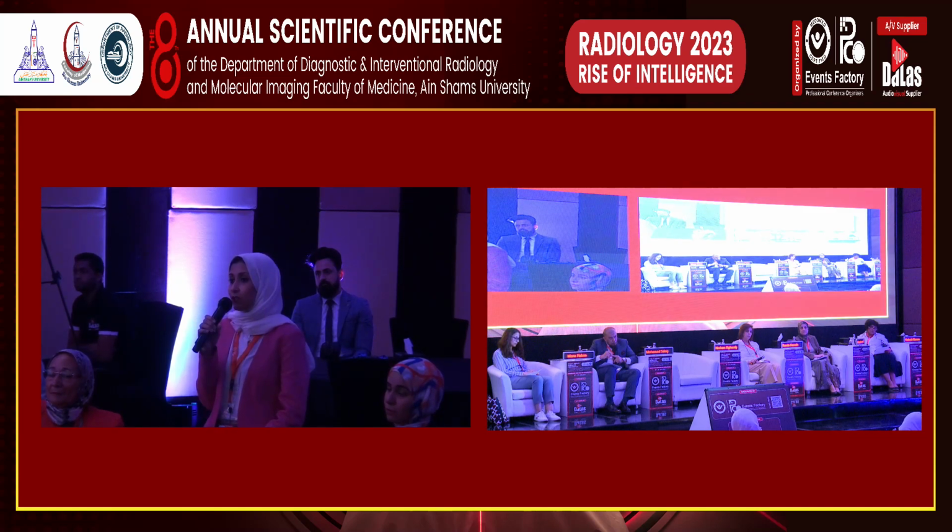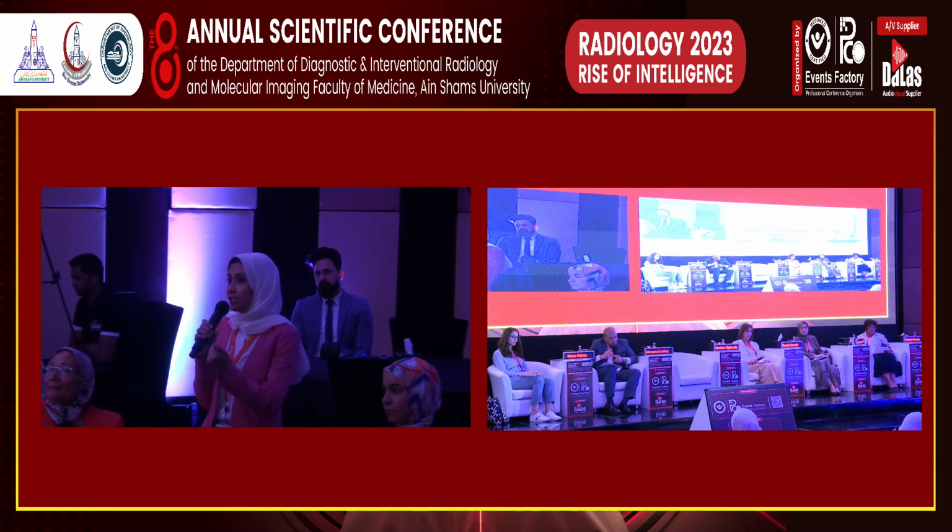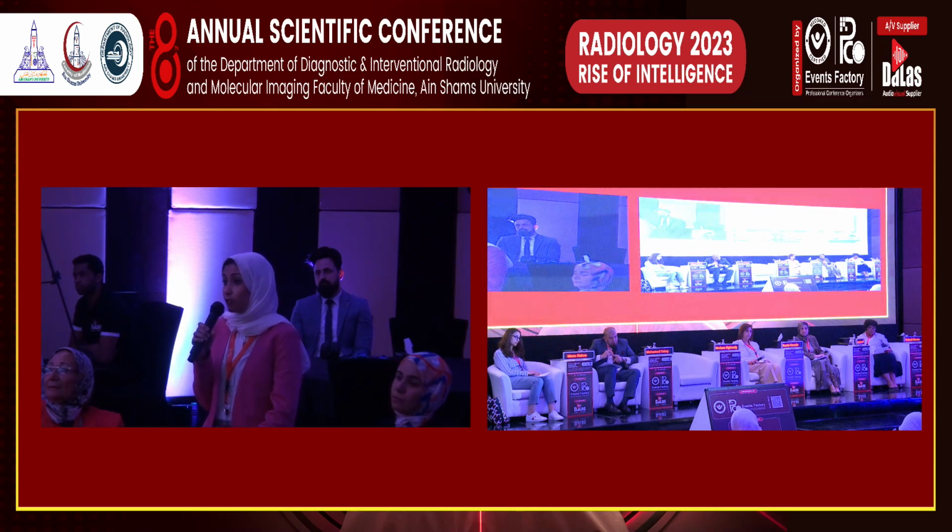لكن المكان اللي هو سسبيشس اللي فيه سوفت تيشو نيوبلاستيك ومالجننت هو عمال ياخد الاف دي جي، عمال ياخد الماده وعمال ياخد الجلوكوز، فهلاقي المكان بيرزيستنت، نفس المكان دوت فيه increased focal uptake موجود زي ما هو بالظبط. وكمان في بعض الحالات ومعظمهم بلاقي ان الاف دي جي الاس يو في ماكس نفسها كمان عليت، يعني الاقيها في الايرلي سكان مثلا 6 أو 7، لما ابص على الفيلم الديليد الاقيها بقت 12 بقت 10.